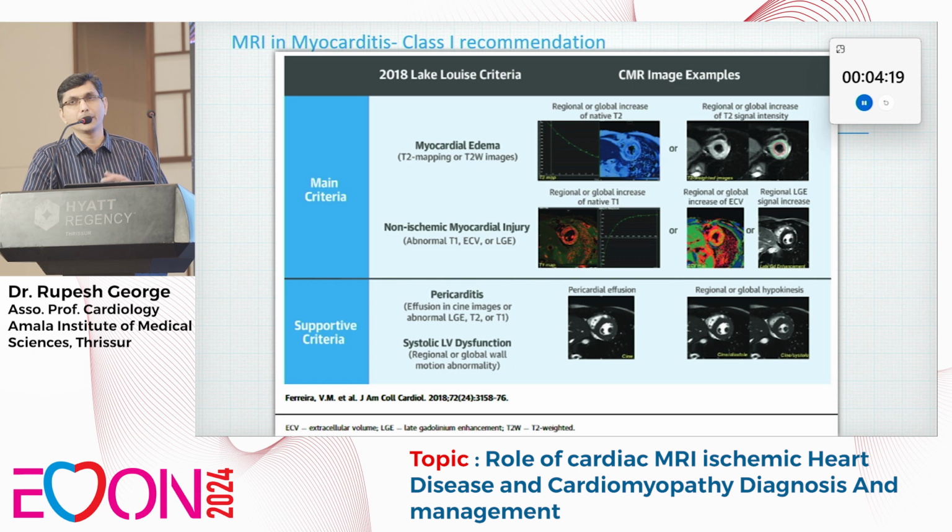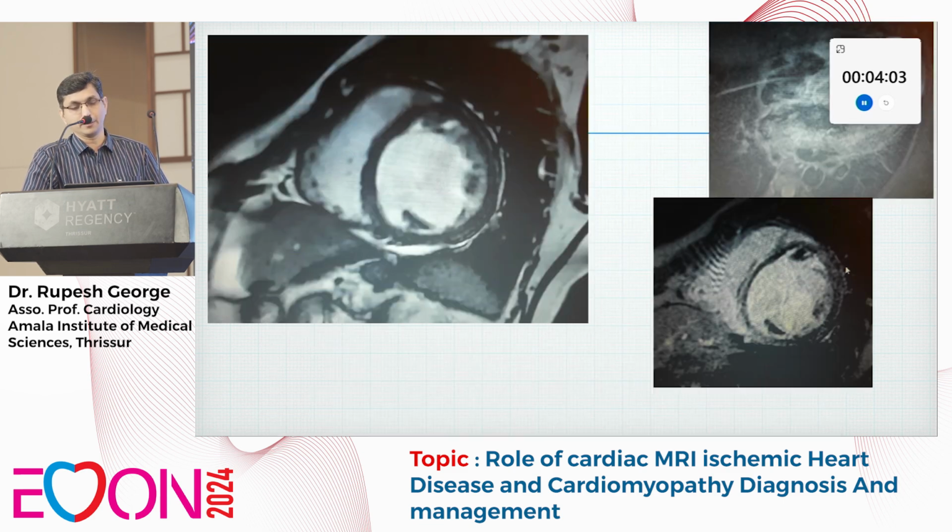If there is both edema and injury, it will go in favor of myocarditis. And for myocarditis, according to the guidelines, there is no need for tissue diagnosis or biopsy now. Cardiac MRI can give clear-cut evidence of myocarditis by the image properties.